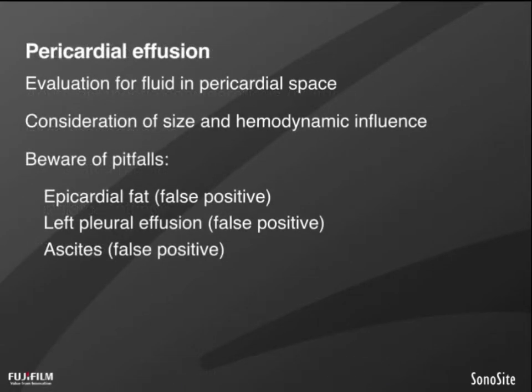Now let's move on to the assessment for pericardial effusion. A very common and early part of point-of-care echocardiography, the assessment for pericardial effusion made its way into the FAST exam protocols that were developed in the early 90s. So many providers have comfort or some experience in this assessment.